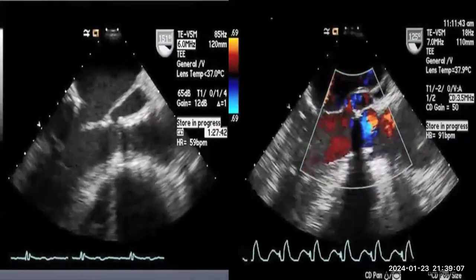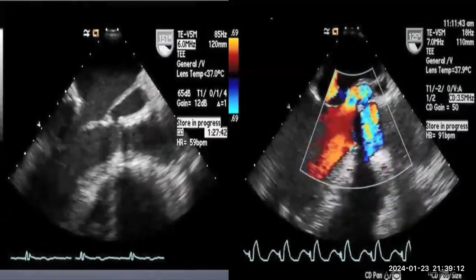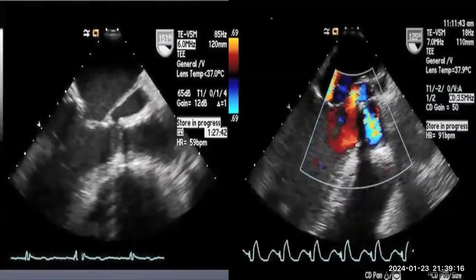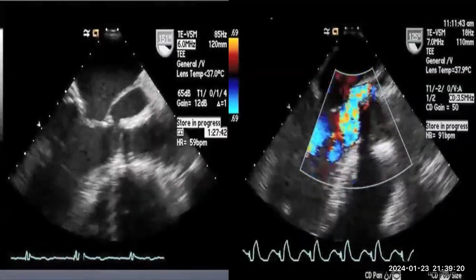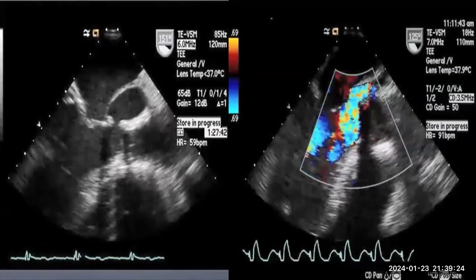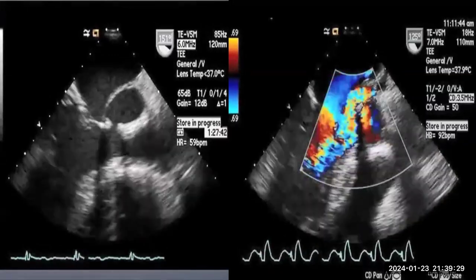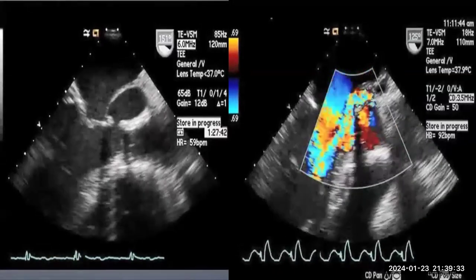I will help you, just tell me what do you see. I can take this, Doctor. يلا تفضل يا حامد. So this is aortic valve. There seems to be an aortic root abscess. First of all, which view is this, Hamid? This is a TE. Okay.